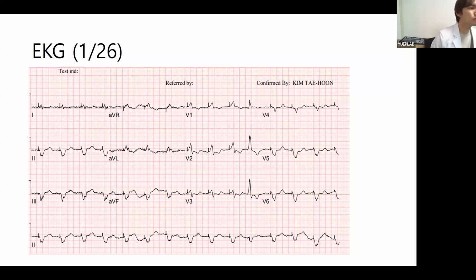very similar. And we can find very similar PVC. Beautiful. And that data.